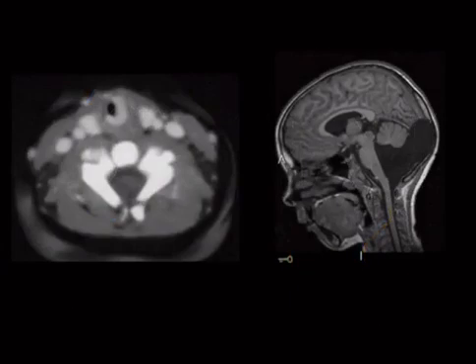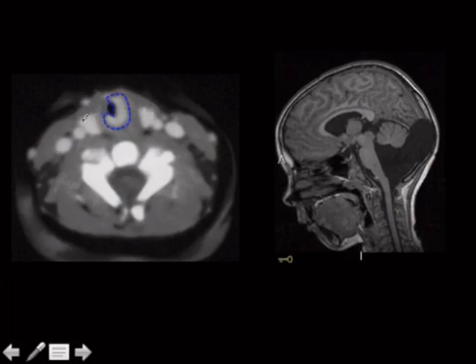So what is a subglottic hemangioma? It's a common thing. What it would look like on CT is that. It's taking up the contrast. It's a vascular thing. It's not the thyroid. Those are more lateral, and there's one on each side, typically on one side like that.